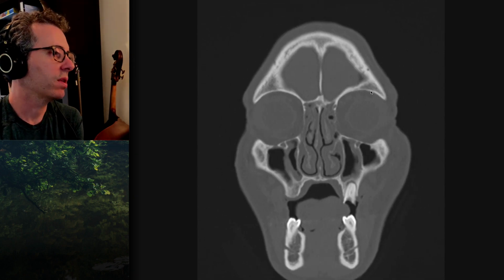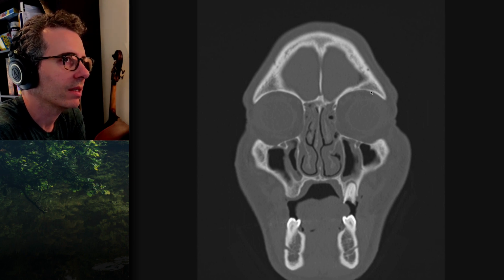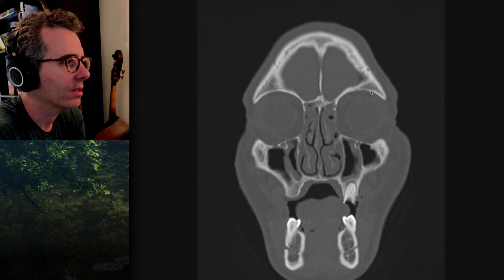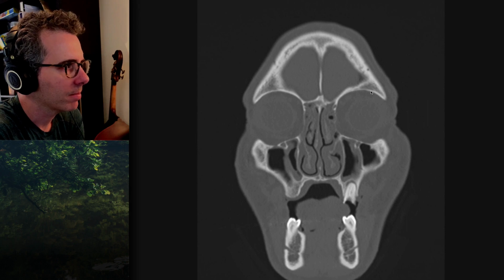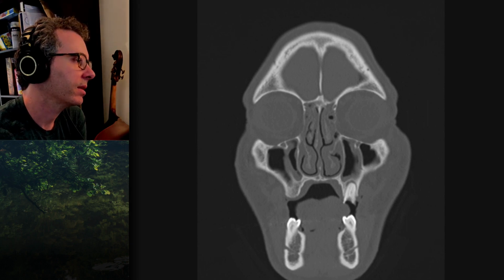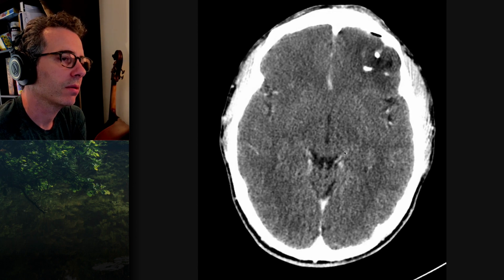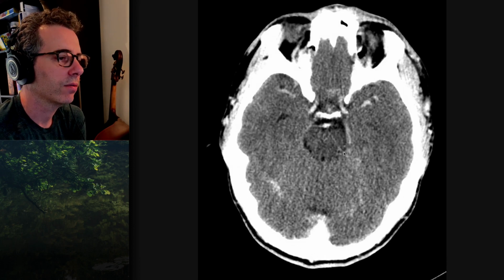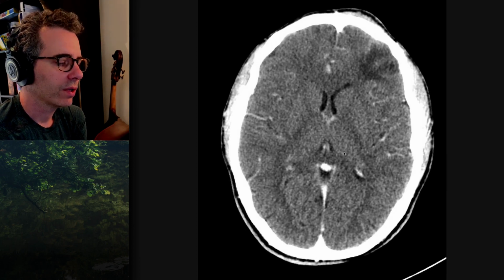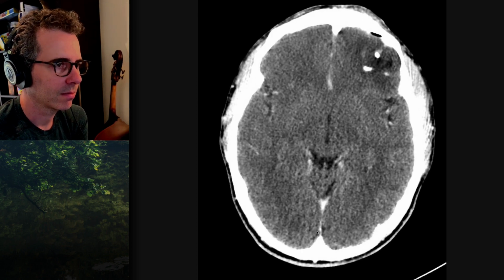The problem with this is that if it's just a contusion, it might only be followed up with some CT. I'm not sure you'd necessarily have to dig those out. I think fragments of bone and depressed skull fractures increase your chance of epilepsy. But there's not much mass effect there, and given contrast, not much enhancement. I'm not sure contrast adds very much in this setting. So what's the real test? MR.